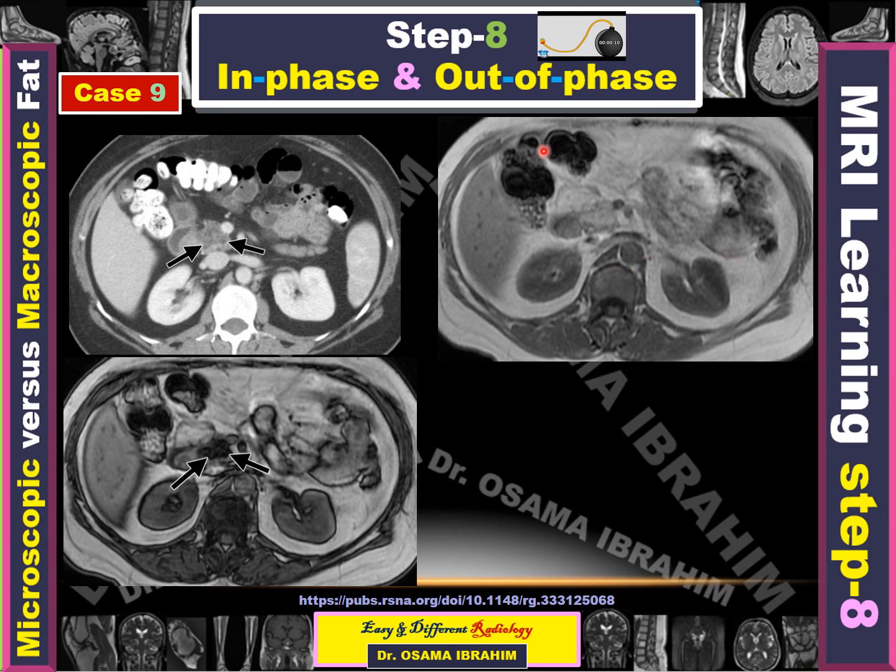Case 9. Are you ready for 10 seconds to detect the opposed phase? Is it this one, or this one? And after that, look at the signal. Okay, time out. This one is the opposed phase.